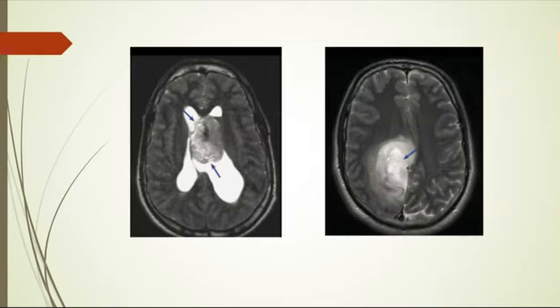So, what do you think is going on here? There is a mass. Okay? What feature of this mass? Well, other possibilities?